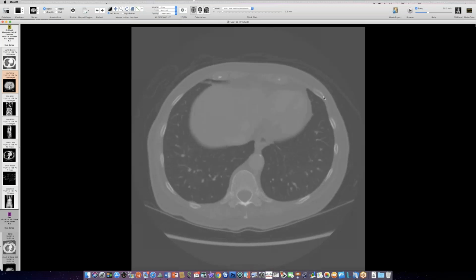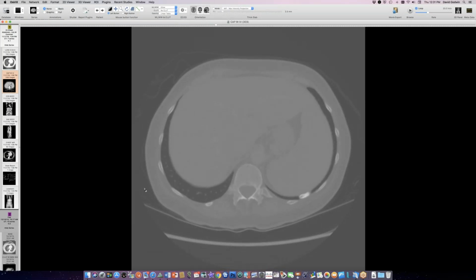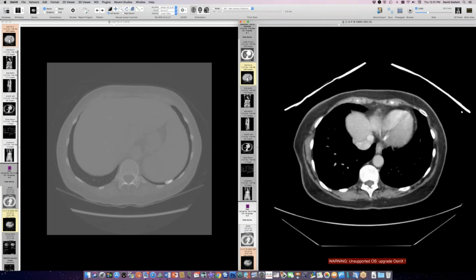Dave, this is Seth. Is it moving? Do we know that this thing is actually freely floating in the pleural space versus matted down? It is moving, and since this one 3 months later, it's moved even farther medially. So let me show you the original imaging here at the same time, and you can see that it has changed locations.